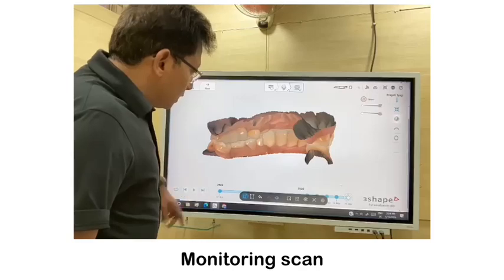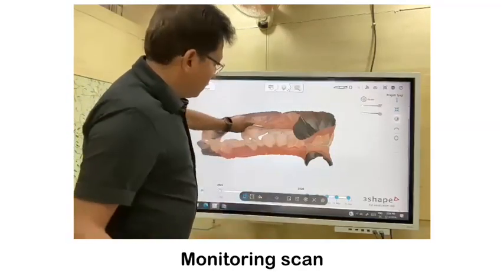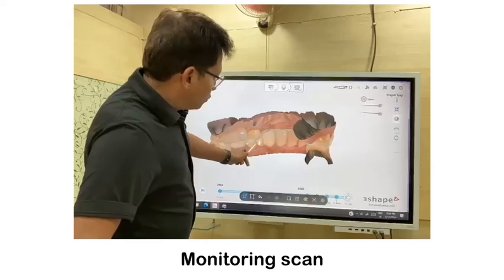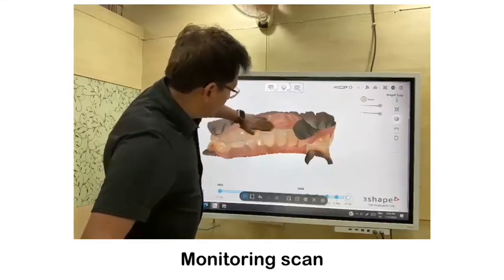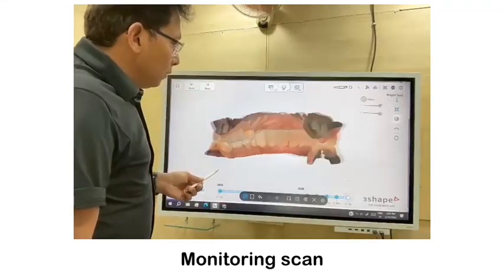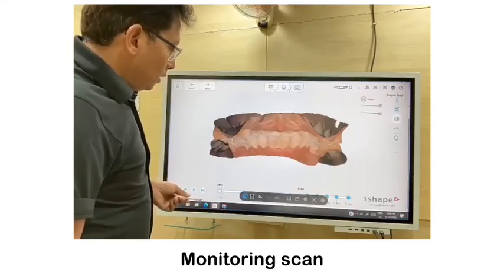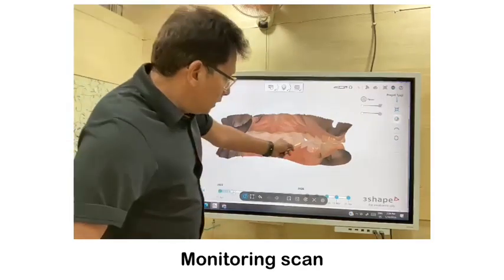Now this is the initial, and see this here. We corrected it with composite. Some natural teeth were corrected with composite. So composite against composite, ceramic against ceramic, somewhere Emax against zirconia or Emax. So this is a complex treatment, and multiple things are to be decided, and in multiple phases. So this is a step here, the initial. If you see this, then we rebuild it like this.